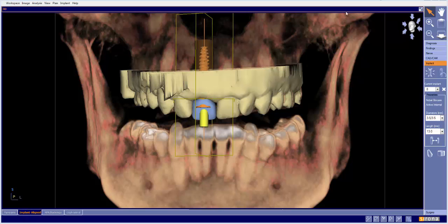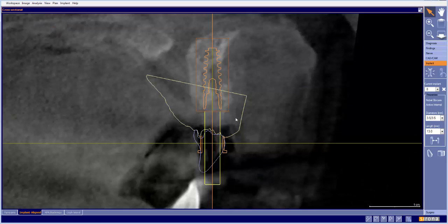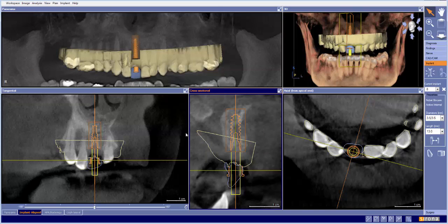The other issue is our measurements from the tooth: the tooth margin will no longer be where the CEREC scan is, but instead will probably come to about right here. Okay, so just a little bit of data, just to point out some potential discrepancies. So let's just focus on our implant plan.